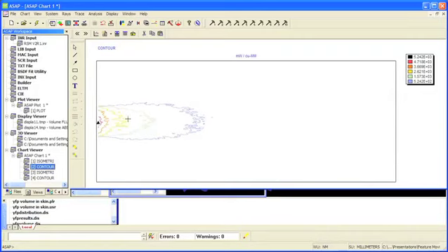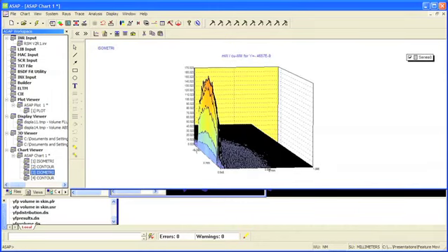Similarly, in a contour plot, we can look at fluence as a function of depth, and we can see deep penetration within the skin for energy. Now, comparing those to the absorption plots, we can see a high confinement of energy in the epidermis, and then a steep drop-off and fairly lower absorption in the dermal layer.